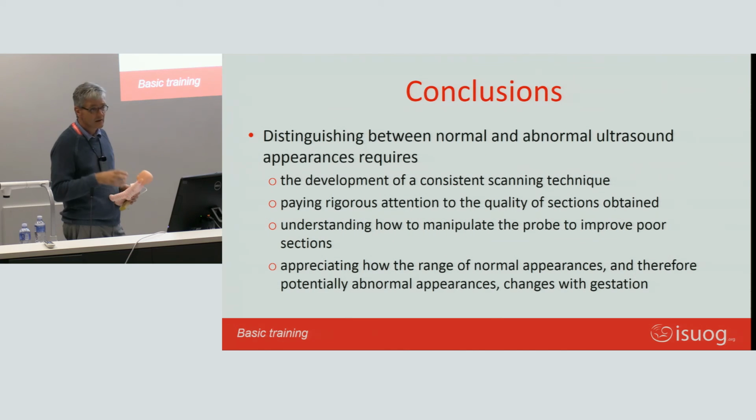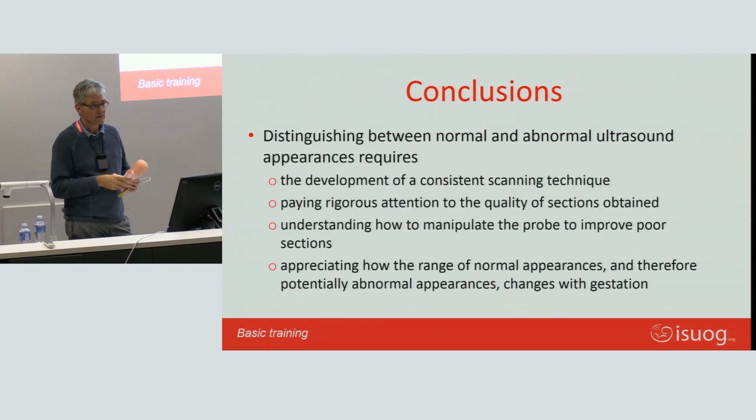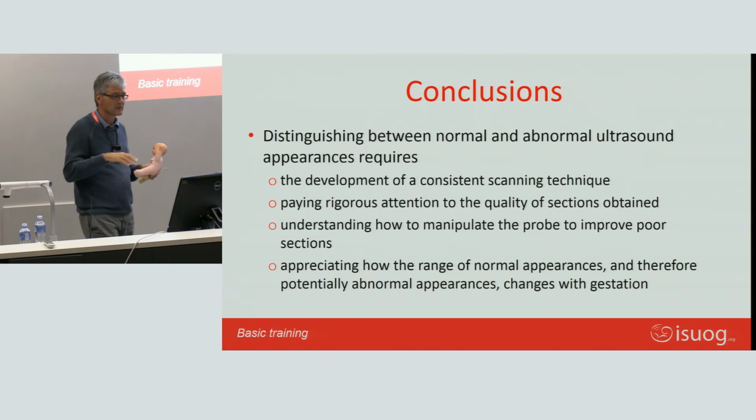And for each section, make sure you've got the right quality of section. It should be a picture you can send to someone saying, I've seen this abdominal scan, and they can say, oh, great, it's been magnified to fill the screen, the focus is right, the settings are right. Not that you get an email back saying, next time send me a picture, don't send me a postage stamp of a picture.